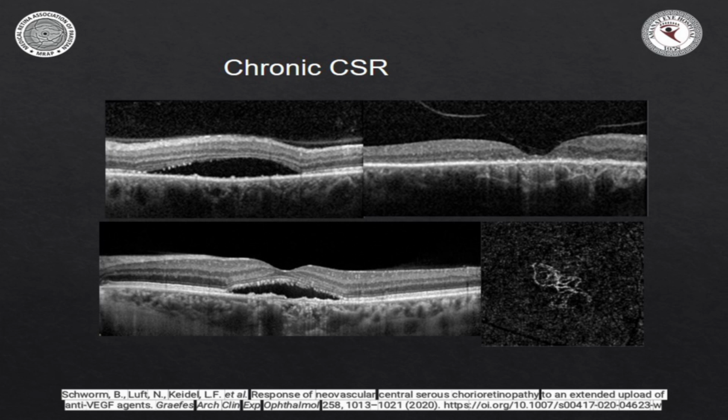And then you have to be very mindful of atypical CSRs. So you find there is a fluid under the fovea, but what you see is that there are a lot of intraretinal cystic spaces as well. That is not a typical CSR presentation. Typical CSR की pathology ही नहीं है कि वो intraretinal edema cause करेगा. So in which case you have to be very mindful.